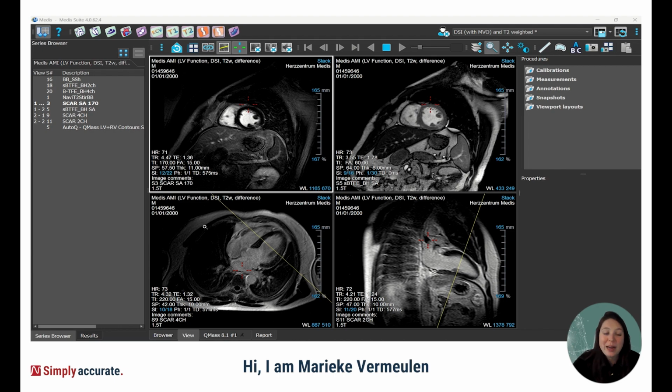Hello, I'm Marieke Vermeulen and in this video I will explain how to do a scar analysis with MEDIS. So for the scar analysis we're going to do an analysis on late enhancement, but I can also do an edema analysis on T2 weighted to calculate the myocardial salvage.